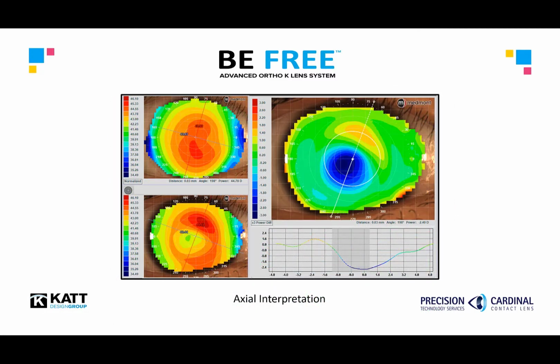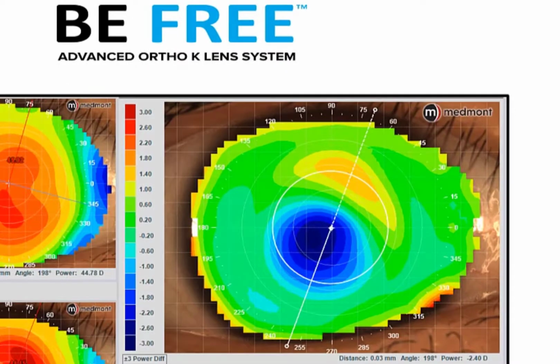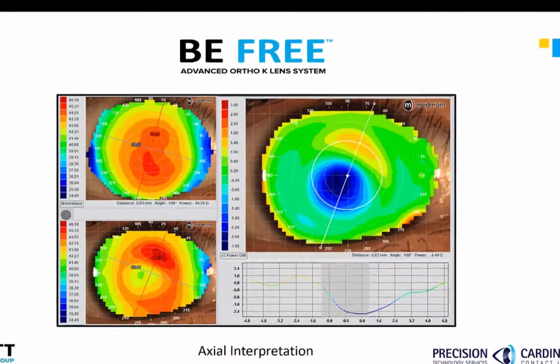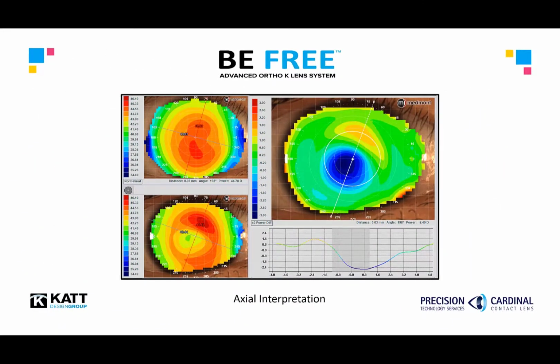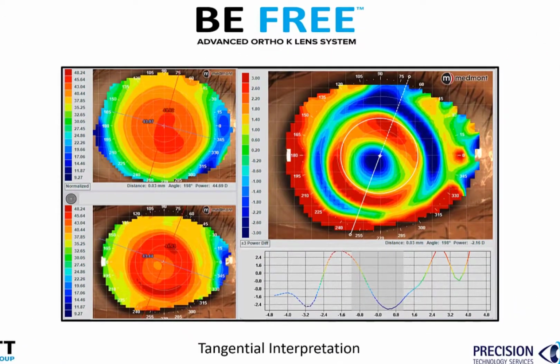In our second case, we see an effect that appears to be displaced low on this cornea. The axial interpretation shows a blue treatment zone inferiorly decentered in relationship with the visual axis and the pupil margin. These outcomes can result in reduced quality of vision and possibly some desiccation of the inferior limbal or conjunctival epithelium. The tangential display confirms the inferior displacement seen on the axial map.